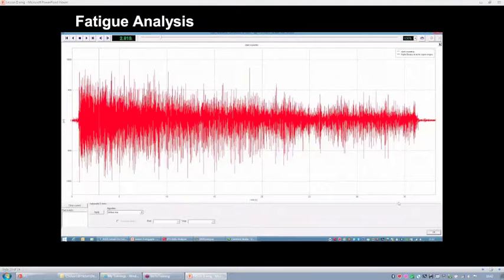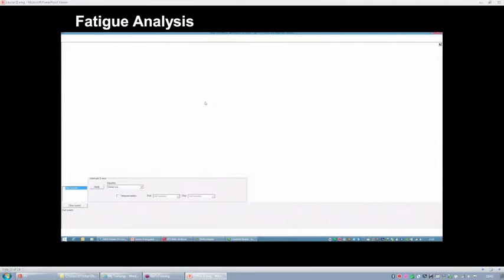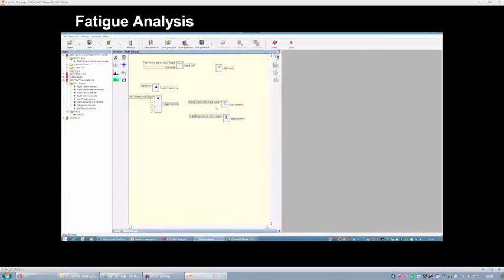So here we have an isometric contraction. I want to start from that event, and I want to stop at this one. So the start and stop events will be the other two inputs of this block. And then you have to identify the time duration of the epoch that will be considered to perform the computation of the median frequency of the spectrum.